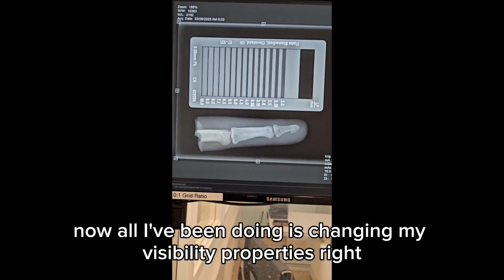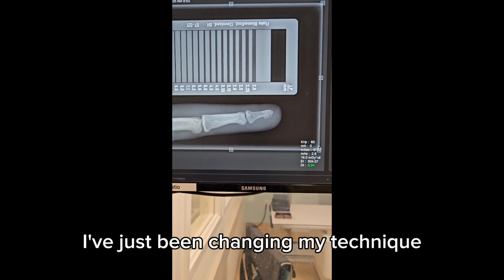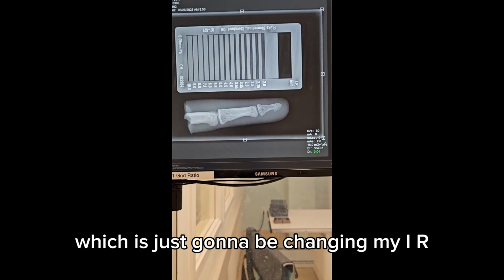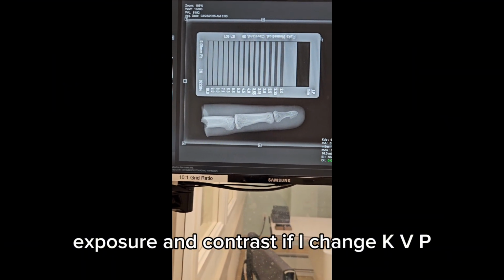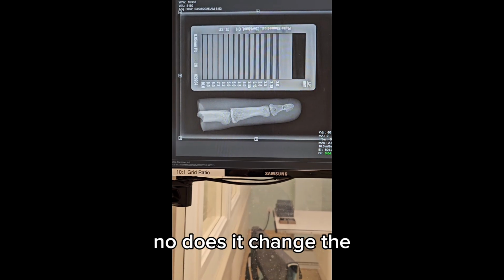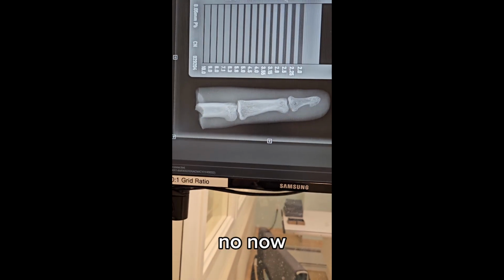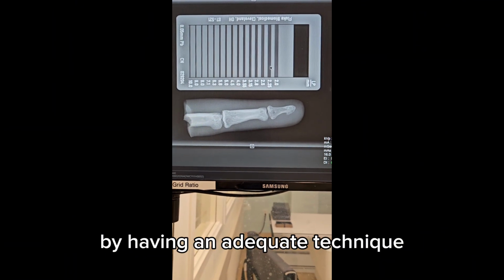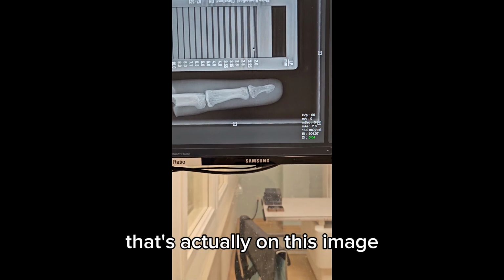Now, all I've been doing is changing my visibility properties, right? I've just been changing my technique, my KVP, and my mAs, which is just changing my IR exposure and contrast. If I change KVP, does it change the size of the body part? No. Does it change my ability to see fine detail? No. Now I need to have the ability to see fine detail by having an adequate technique, but it does not change the amount of resolution that's actually on this image.